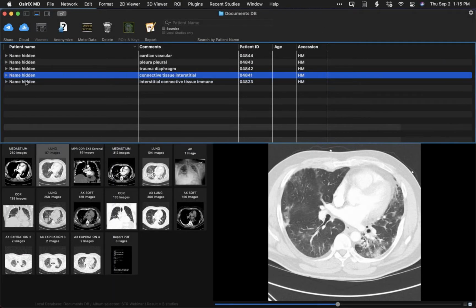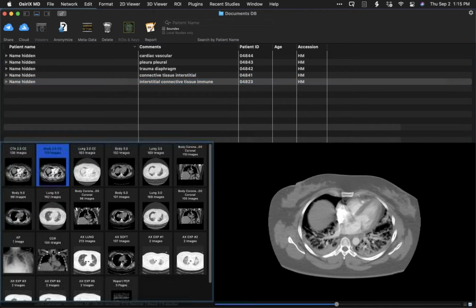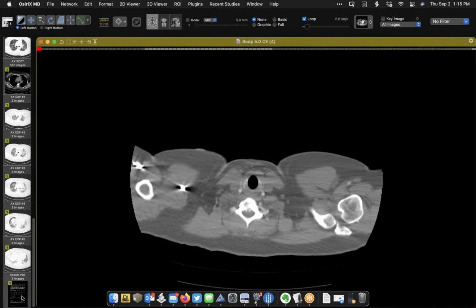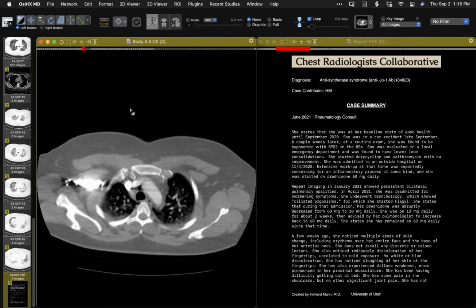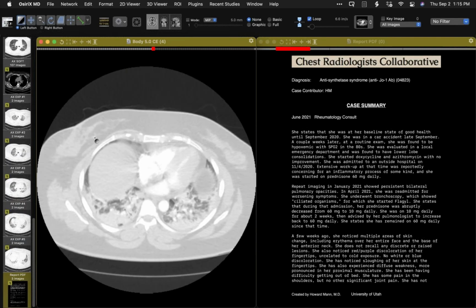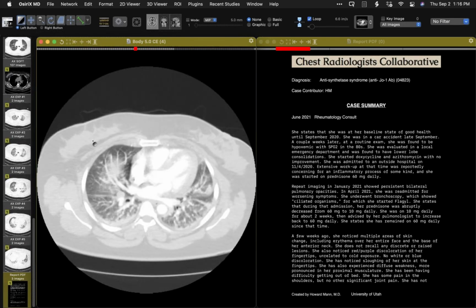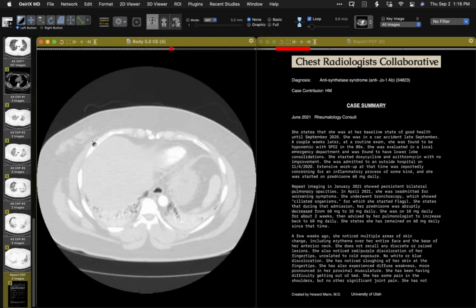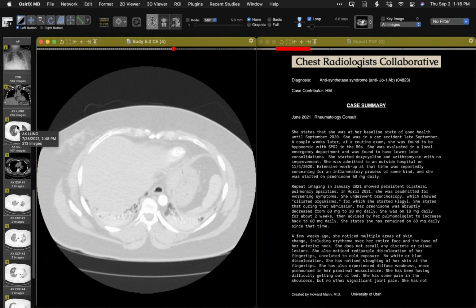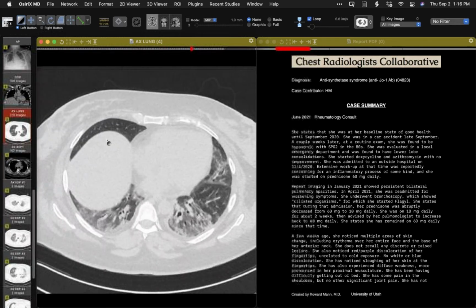And the last patient with what turned out to be Jo 1 is this patient. And I'll bring up the history alongside to see the evolution of that. But a CT-PA was done at some point. This is no PE, but basal lung opacities, confluent, consolidative opacities involving multiple segments of the lower lungs at that time. And here is one later on showing still a lot of disease.